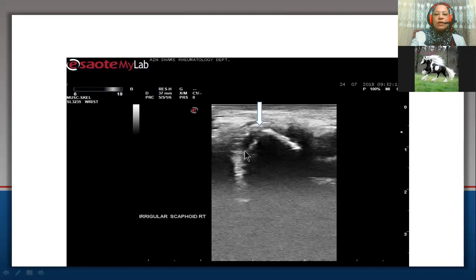So please don't miss this bone irregularity in a patient, especially when kept on a large dose of steroid for a long time, to detect or early diagnose the presence of avascular bone necrosis, fracture, or bone tumor, to be confirmed by MRI. So please don't miss this.